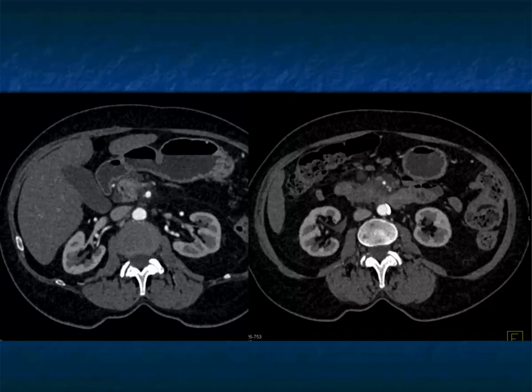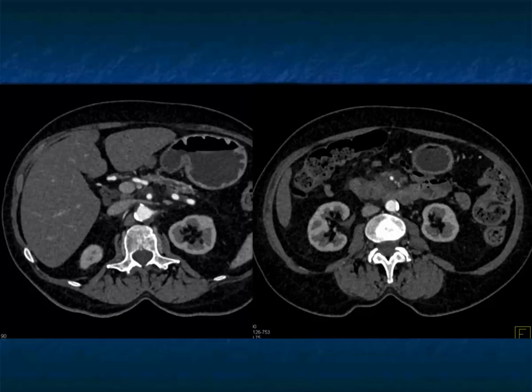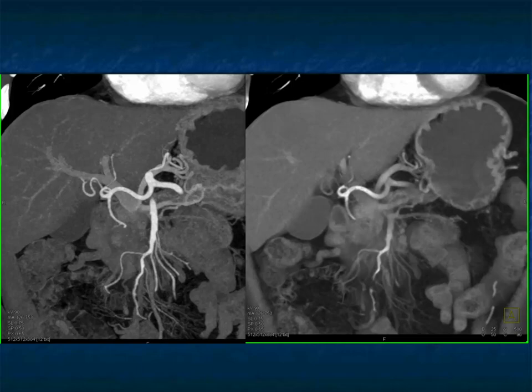We follow IPMNs. Of course, only about 3% of patients with IPMNs develop cancer over their lifetime. But you need to look even more carefully because you're going to be following these patients for many years. But when you see the duct dilatation, you've got to be thinking about a mixed type IPMN. And so you have to be worrying about cancer. And again, it's not so subtle anymore because there's the mass and the patient does have arterial involvement.